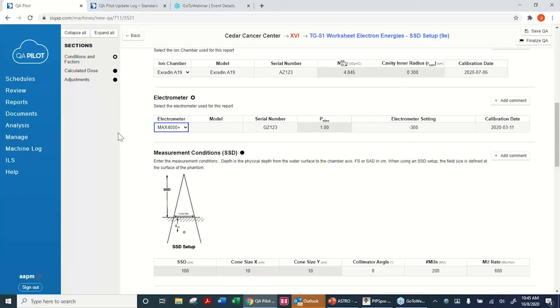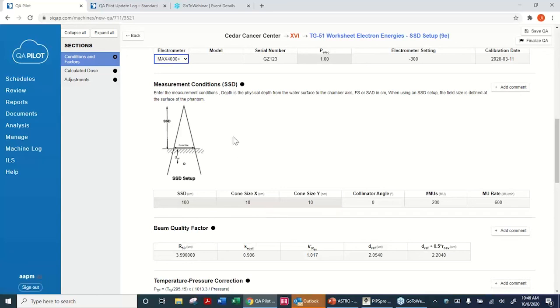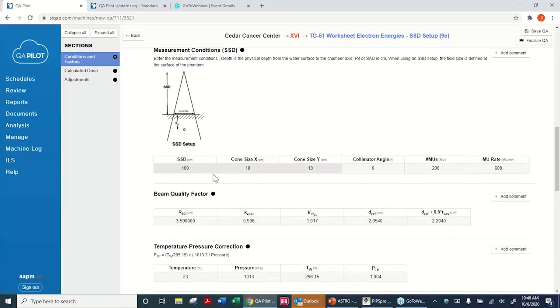Which I highly encourage because we've just released the DoseView 1D 2.0 software, which is moving DoseView 1D to our new, wonderfully easy, intuitive workflow, same as our DoseView 3D platform. So again, another piece of integration. But back to this, there are certain things that you've set up already under the LINAC. Here you can set up other things.